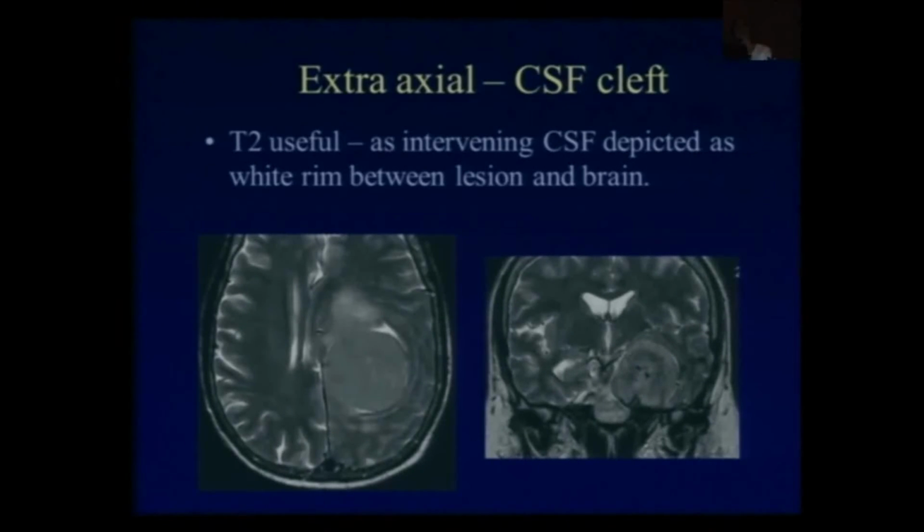When you're trying to look for displacement of the cortex, the first thing that you want to see is that there is no compromise of the architecture of that parenchyma. It is just normal appearing but displaced. You have a vessel in between this lesion, as seen better here.